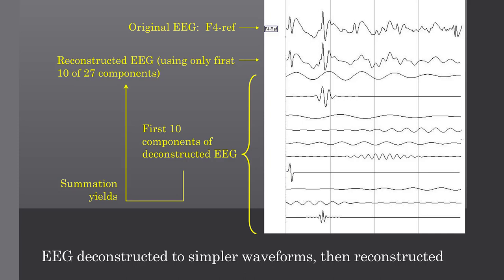So in Persyst, the default frequency bin size is 0.5 hertz. That is adjustable, of course. There's a trade-off between time resolution and frequency resolution. So you find something that's appropriate to the application, which we believe we've done in that configuration. And then you can add those up to get band power. So if you have half hertz bins, you can say, all right, I want to do delta, theta, alpha, beta just by adding the bins together that make up that frequency range, and you get an amplitude.